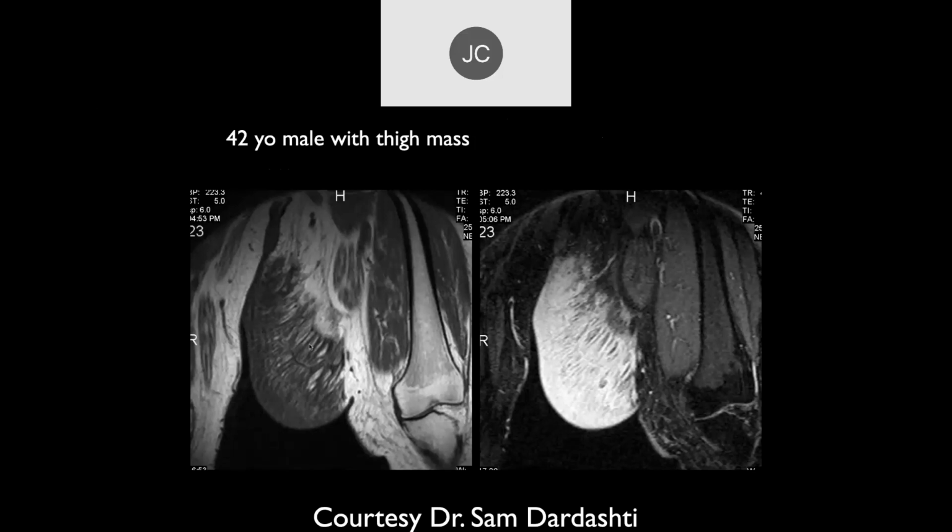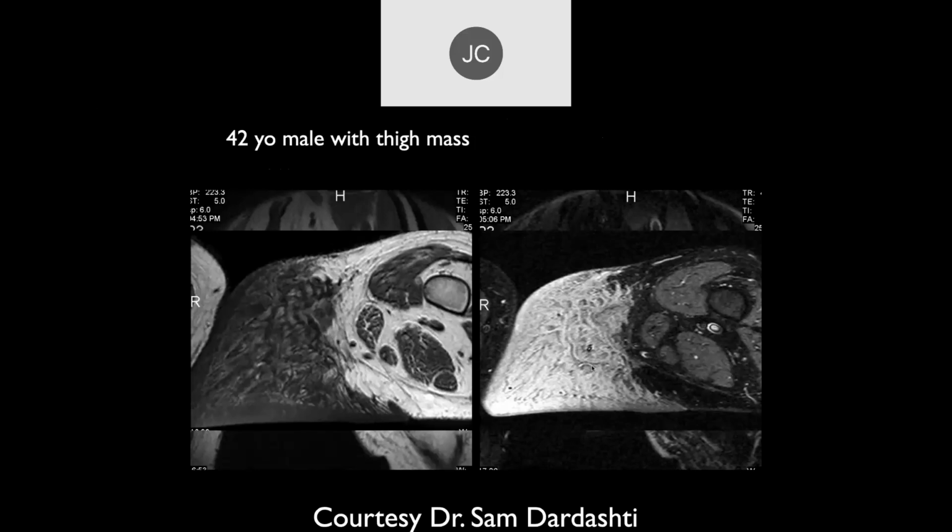Yeah, it almost looks like it's muscle. There's striations within it. Yeah, well, but it's not muscle. So what else could it be? It's a very characteristic appearance, a striated kind of appearance like that.